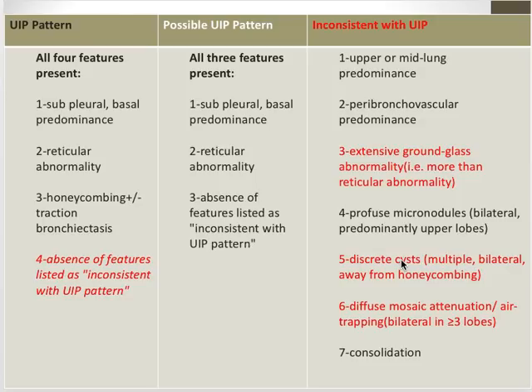Before ending this case, I wanted everyone to know what honeycombing is. It is nothing but destroyed and fibrotic lung tissue, which contains numerous cystic spaces. On radiograph, honeycombing usually appears as ring shadows, usually small, 3 to 10 mm in diameter with 1 to 3 mm wall thickness.